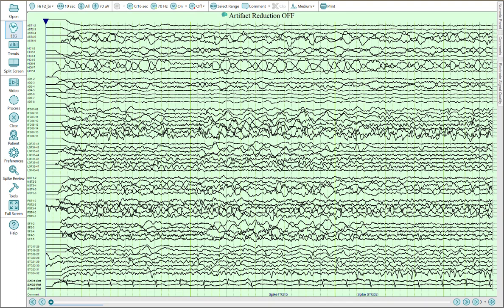that really is just a demonstration that if you're doing something over short time frames, then Insight 2, available from the Tools menu, is designed to do all sorts of analysis over shorter time frames, and Persist, the main interface, really over longer time frames, although you can show the trends in both.